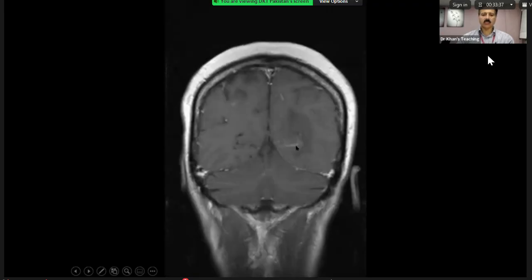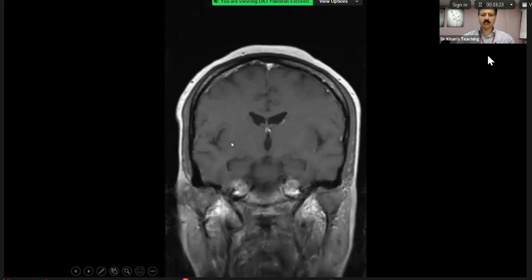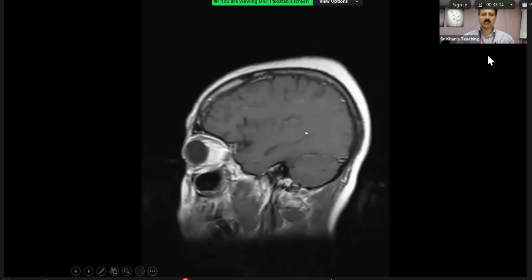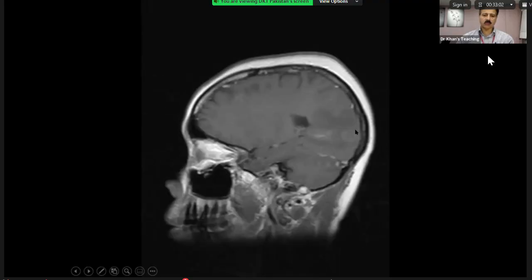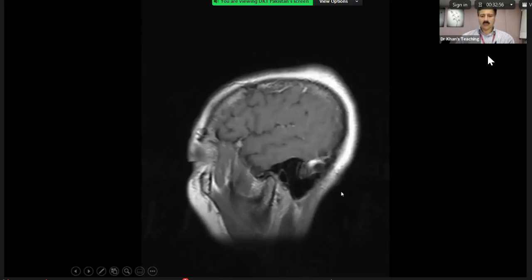How does it look, and how is it going into the various regions? Now, this is a good one just to develop your eyes, where you can see this leptomeningeal enhancement. Leptomeningeal, another deposit sitting here. And on a sagittal, look at this one. It goes along the gyrus, and then enhancement goes into the subcortical region also. Again, here also. And again here. Okay.